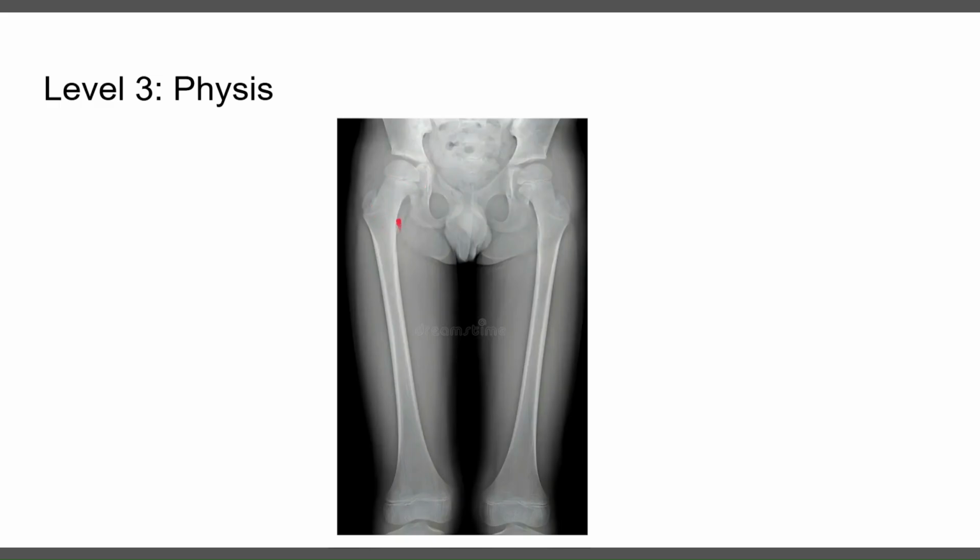Another physis here. There's actually another one that's pretty much closed, another physis here, and the distal physis right along here. Historically, orthopedics was actually a pediatric field. We were just straightening kids' bones. So a lot of the nomenclature is a remnant of treating children. So we still label bones in relation to the physes, even when the growth plates are closed.